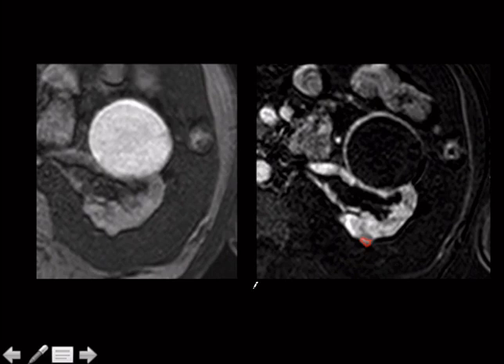Also, I just want to make a brief comment, this is just my opinion. I would think that if they would show you a subtraction case, it would not be an eye exam. It would be obvious that the thing was enhancing or it wasn't. I don't think they would be like, oh man, is that little speckle there? What do I do with these little speckles? That's not enhancement. Don't call that enhancement. It's going to be white in the middle if it's enhancing, if they're going to show it to you like that.